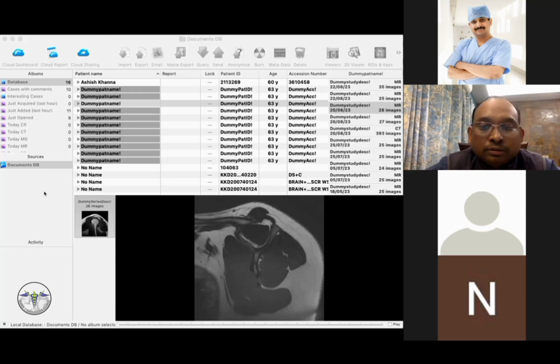So this was how we calculate, when we have to see how the Bankart lesion is there. When we see a Bankart, whether there is a labral tear or there is bone loss along with it, then we have to see the Hill-Sachs lesion and the glenoid track, and then do the calculation to finally come to a conclusion whether it is an engaging or non-engaging type of lesion. So this is what it is, in gist.